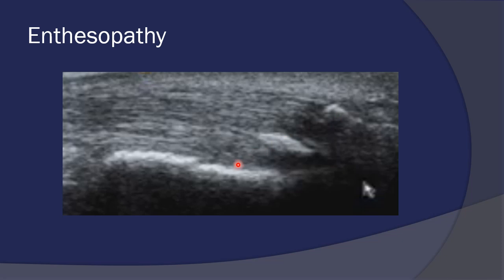A pathology known as Haglund syndrome is to be mentioned at this point, where we can find a dorsal calcaneal spur with tendinopathy of the distal Achilles tendon and retrocalcaneal bursitis. This triad is known as Haglund syndrome.